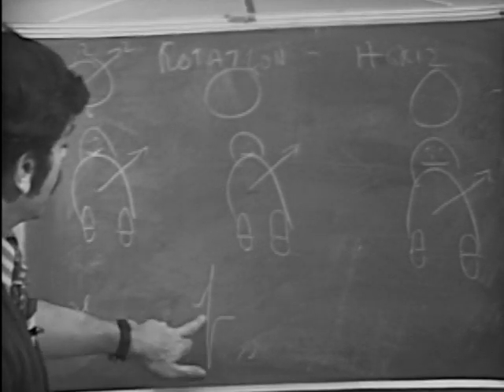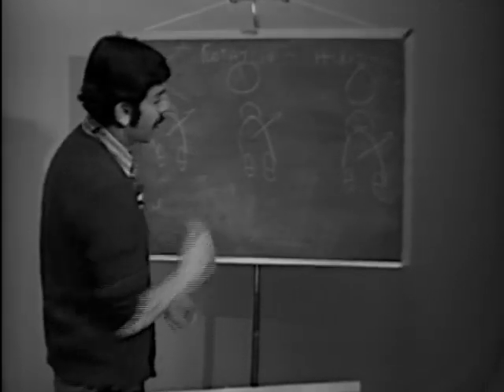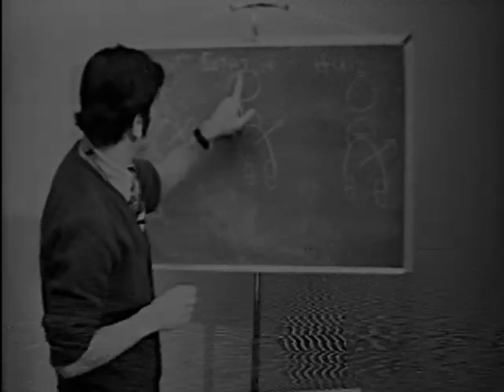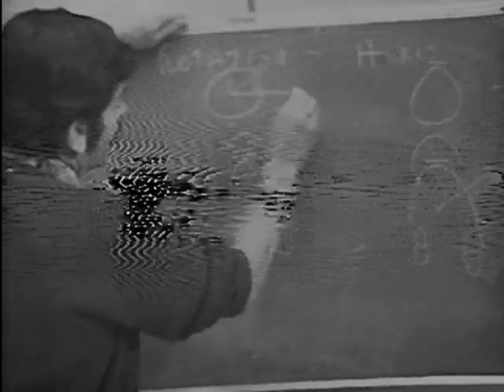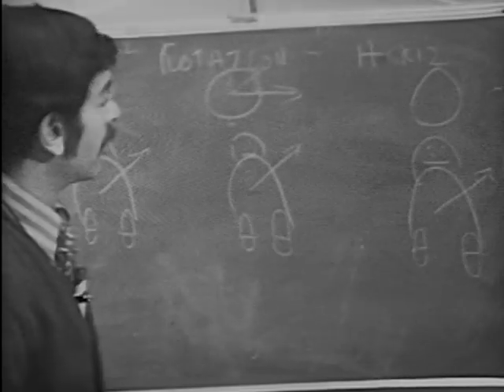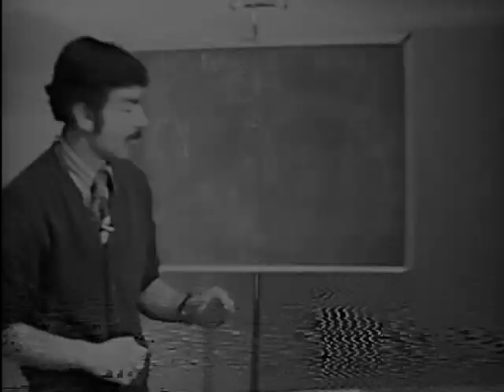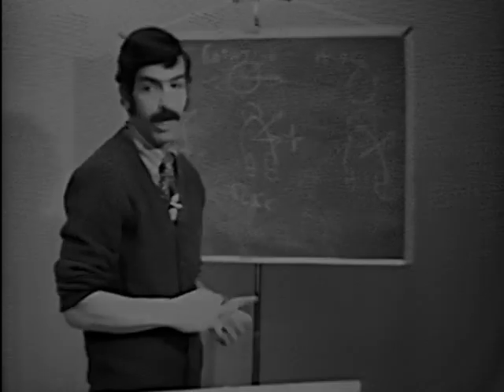Okay, now let's say that we're dealing with clockwise rotation. Now, in clockwise rotation, the position of our isoelectric lead has shifted clockwise. So which way is clockwise? Here's 12, 6. So we've gone from this position to this position, clockwise. So instead of our isoelectric lead occurring in V3, it's now occurring out in V6 in clockwise rotation. So it becomes isoelectric in V5 or V6 now. So this would be an example of clockwise rotation.